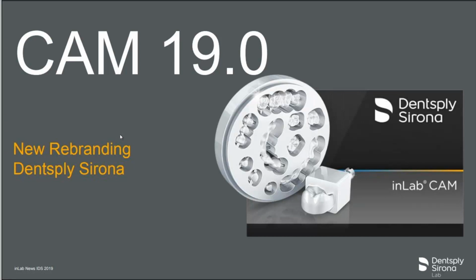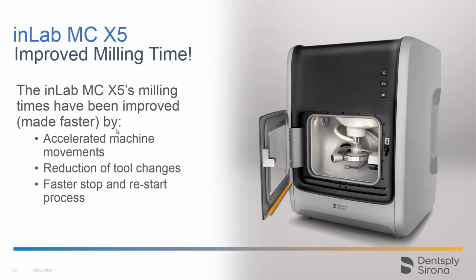For the inLab CAM 19.0 software, we also have the new rebranding Dentsply Sirona. What's really cool is we have improved milling times with the inLab MCX5. It's a lot faster thanks to accelerated machine movements, a reduction in the number of tool changes it has to do, and a faster stop and restart process. I've noticed my milling times have been a lot faster, and you can actually see the machine moving a lot faster.